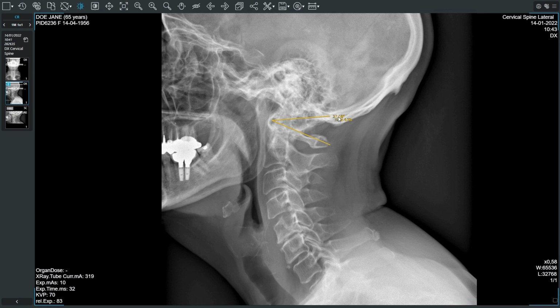If needed, drag the label to reposition it. To adjust the measurement, click on it and drag one of the segment endpoints. To move the measurement, drag it to a new position. To remove the measurement, click on it and press the Cancel key.